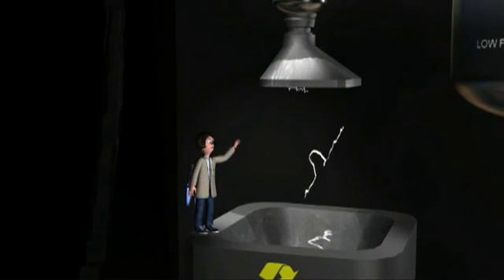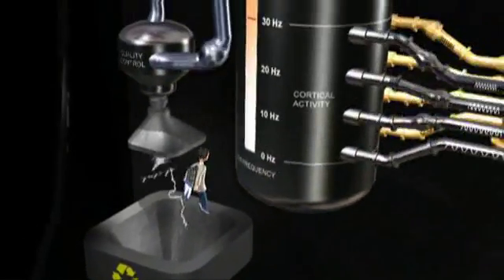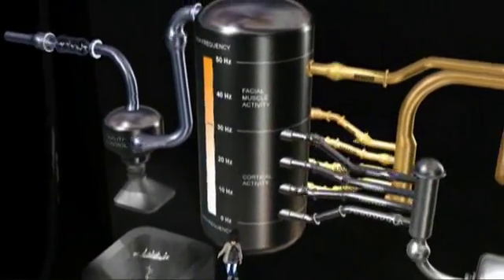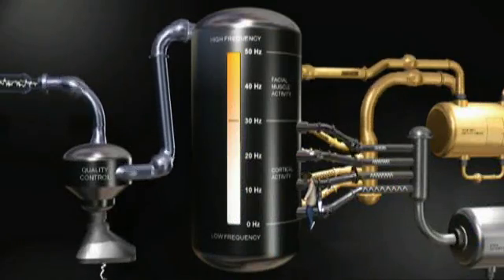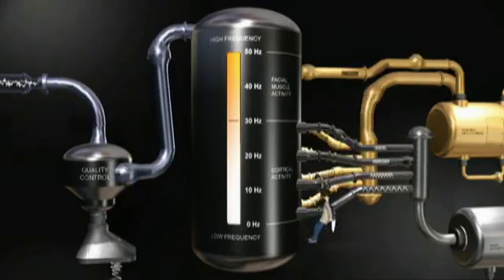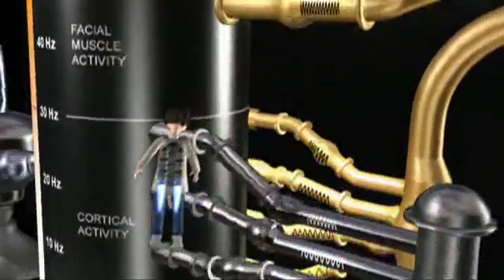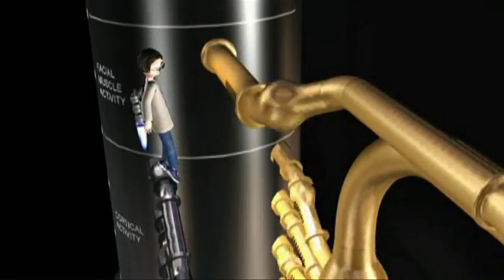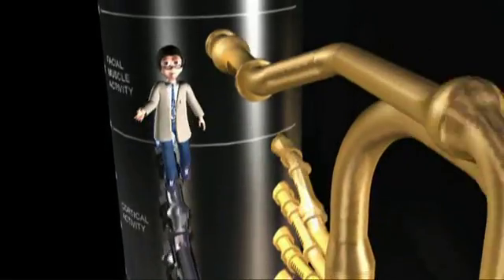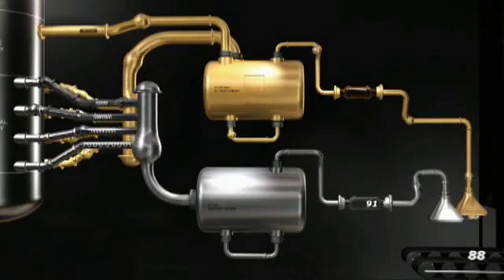The first step is to get out all the extra stuff, such as ECG signals and diathermy artifacts. Once the artifacts are removed, the signal goes into this frequency transformer. It separates the signal into frequencies that make it up, starting with the slower frequencies down here, which come from the cortical EEG, to the faster ones originating from the facial muscles. This top pipe contains the highest frequencies, which are originated from the facial muscles. The faster frequencies can be analyzed quicker, so you get the information faster. This is the key process right here.